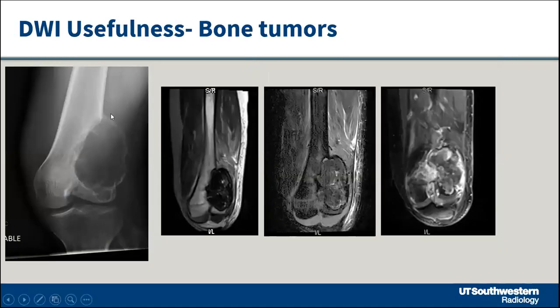Now here is a different kind of tumor. It extends to the epiphysis, which giant cell tumors do. It's expansile, it's soap bubble. It's quite dark. And dark tumors we equate with giant cell tumor, and that's how it should be. And if you do contrast, they show heterogeneous enhancement where you can say, oh, is it giant cell sarcoma or something else I'm dealing with?